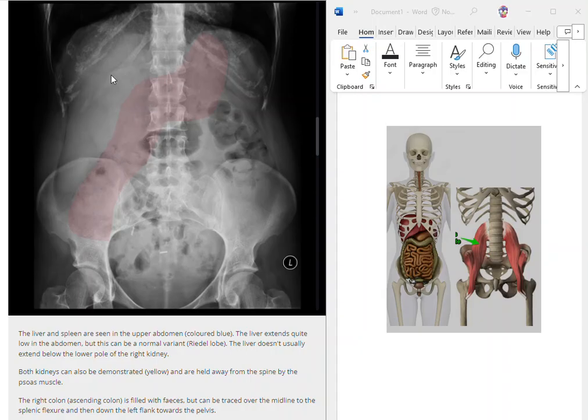Right colic because it's on the right side. Liver's on the right side. It all makes sense when you think of it that way. Then it kind of levels out here. Transverse colon, because yep, we have a transverse colon. It loops around up here. There's some superimposition here. So all of this is ascending, right flexure, the transverse colon.